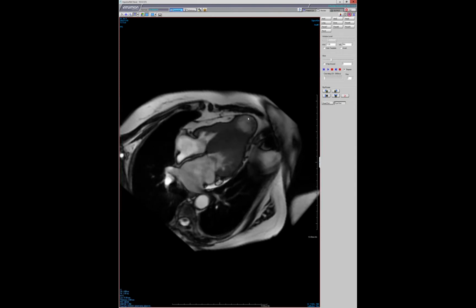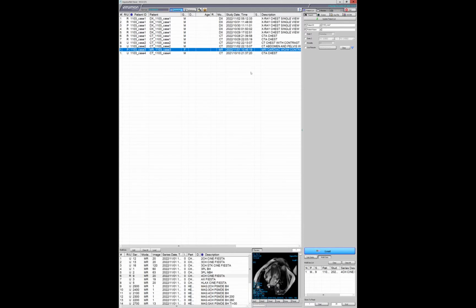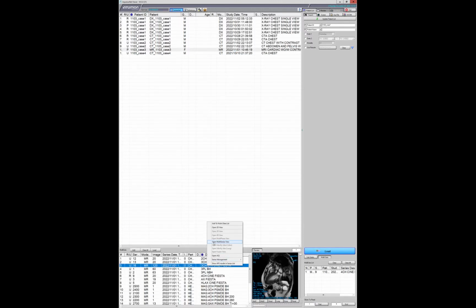But what's interesting is the size of this aneurysm. It's common to see little aneurysms, and I've seen bigger than this, but this is one of the meatier apical aneurysms I've seen with a case of apical HCM in a couple of years. You can see it's quite dyskinetic. It's very thin, and as you would expect, that area enhances quite impressively.